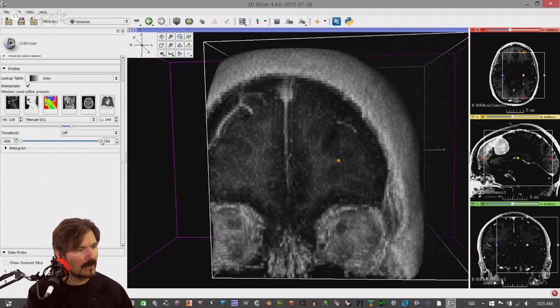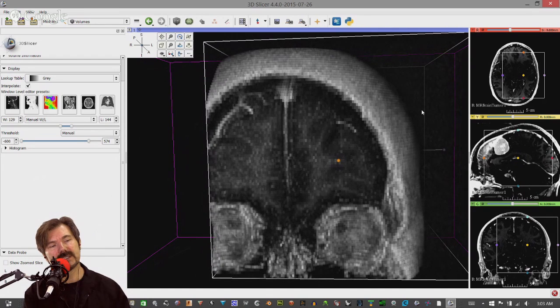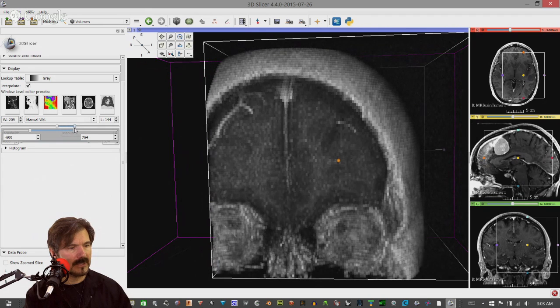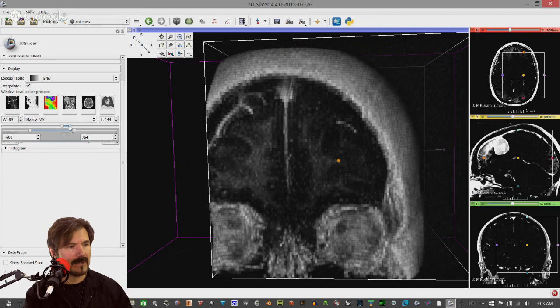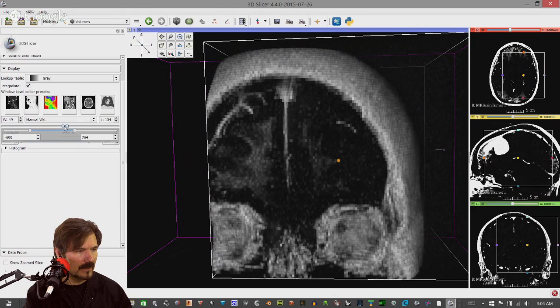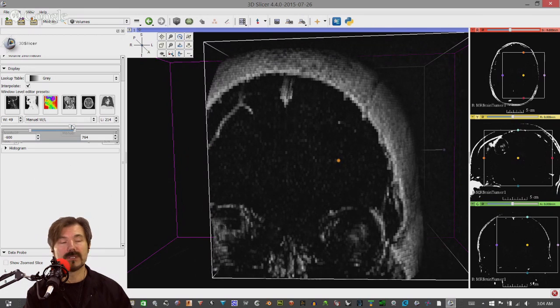And then we can, as mentioned, adjust our thresholds here. And what this does is it kind of separates what grayscales we don't want. And if you notice, as I move these in, you look at the images, notice how we're losing some of that grayscale information. So eventually, as we get closer and closer, if you notice on the right-hand side here, we literally only illuminate one region. And then we can, if we do this correctly, select in the middle without touching the two sides, move it back and forth. So we're moving that threshold boundary to wherever we want it to be.